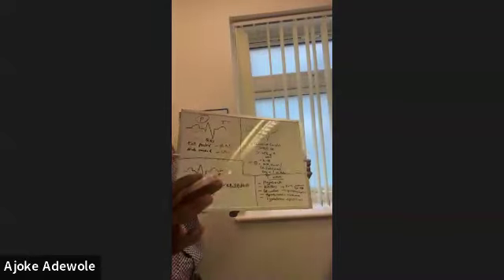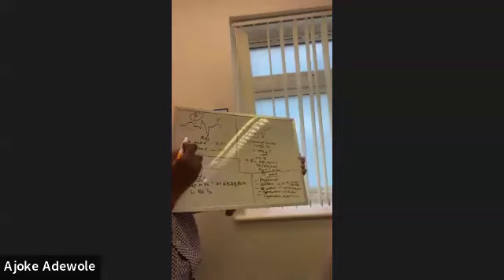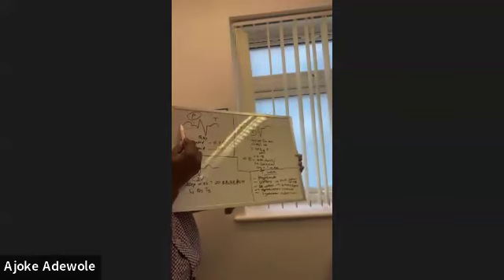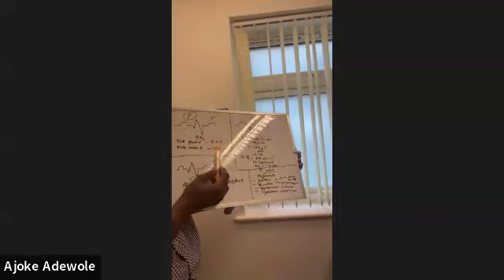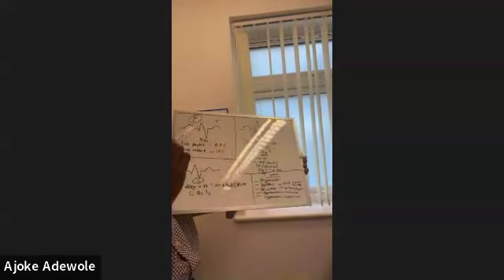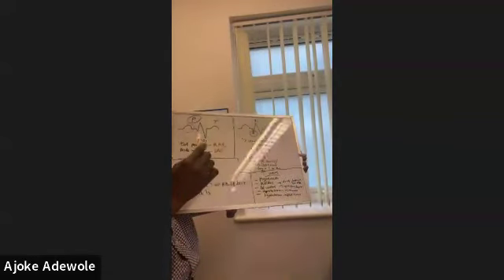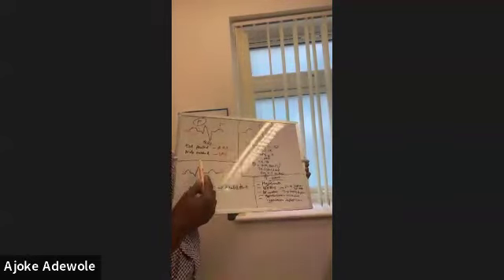And I want to make this short and sweet. There are other videos and there's a full course if you're interested. But if it is tall and peaked, you have right atrial enlargement. If it is wide and notched, you have left atrial enlargement. And there's a reason for this. When electricity passes, the sinoatrial node is located in the right atrium. And so if it's tall and peaked, it could be that the atrium is just way too big. But I promised value in a few minutes, so let's move on.